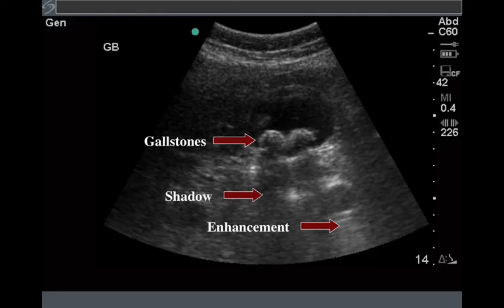Now let's go on to this picture here. Remember, this is the gallbladder filled with bile. Imagine an ultrasound beam coming through here. Now the strength of that ultrasound beam isn't weakened as it travels through this bit of bile here until it starts hitting the back here. An ultrasound beam that travels down here, though, is weakened in these soft tissues as it travels down, down, down. So if you've got an echo that's returning from the material here, the strength of the ultrasound beam is actually going to be quite strong when it hits here, and the echo that comes back quite intense.